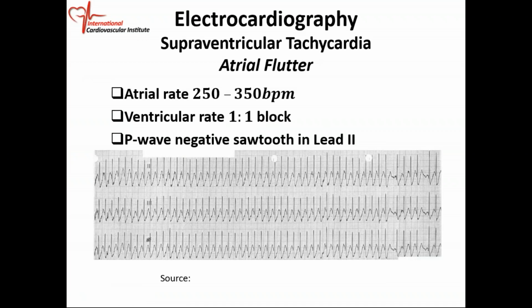All right. Now, if you see this, you're in trouble. Okay. This is atrial flutter with a 1-to-1 conduction. It's not supposed to happen, but it does happen. I've seen a couple of patients with it, and these patients will collapse right in front of you because the heart rate is close to 300 beats a minute, R to R. Heart rate is 300 divided by the number of big blocks separating the R to R. These patients will collapse. They will have no blood pressure right in front of you.